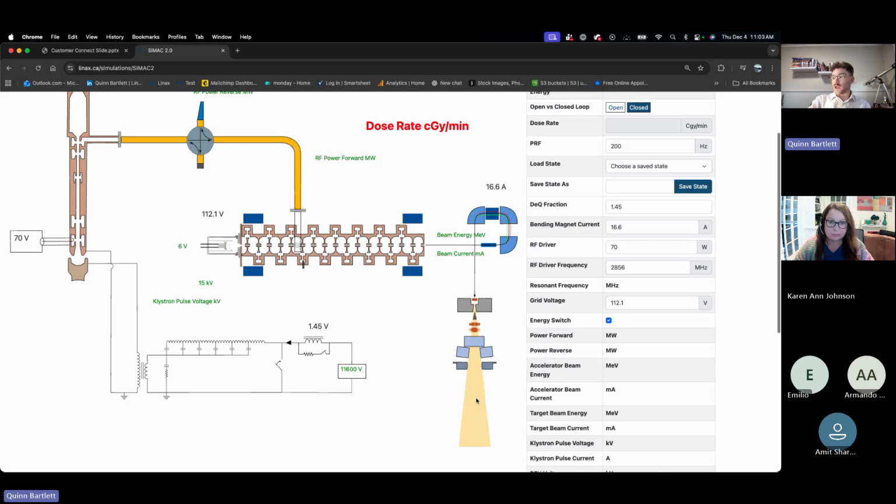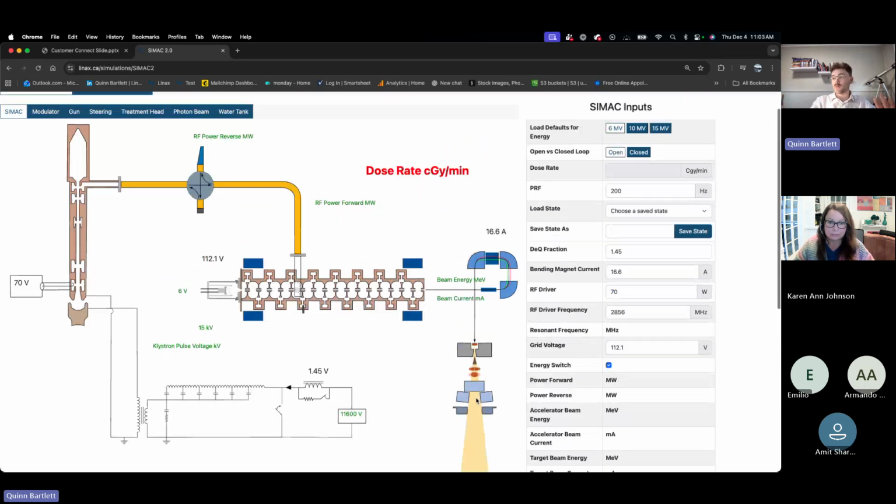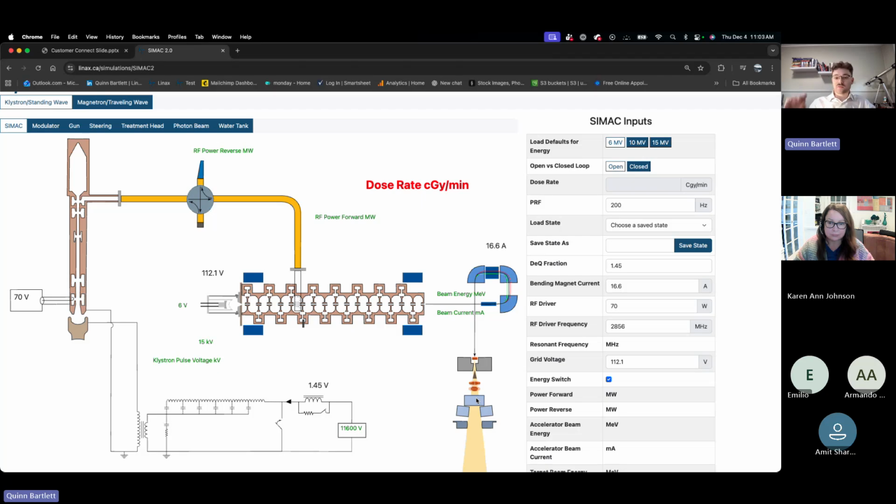What's really great is any beam that you create, so you can really match your machine, you can run with different field sizes, different flattening filters, different steering coils, all this great stuff to investigate dose and your profiles. And we can save these beams however you'd like.